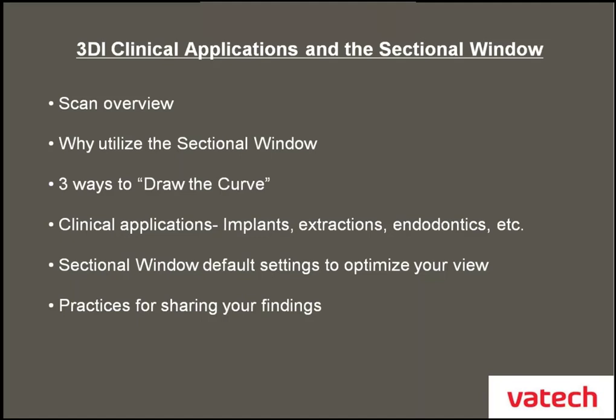Three different ways to, I'm going to call it, draw the curve. Clinical applications we're going to look at: implants, extractions, endodontics, and some other clinical topics there.